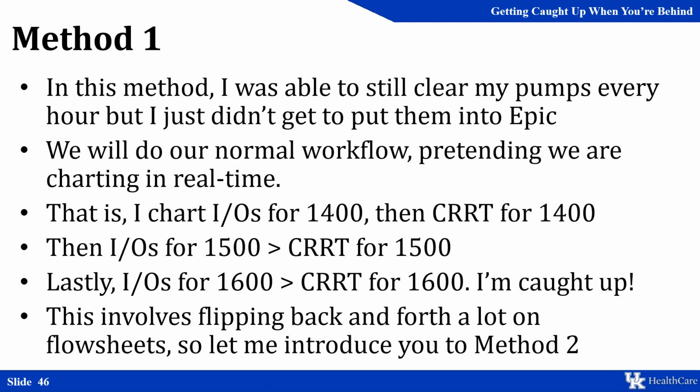However, we have to kind of leapfrog each other on the I and O flow sheet and then the CRRT flow sheet. Thus, we'll chart I's and O's for 2 o'clock, then CRRT for 2 o'clock. We'll go back to I's and O's and chart them for 3 o'clock, then CRRT for 3 o'clock. Lastly, we do our I's and O's for 4, and then CRRT for 4. Like I said, it's a little bit more work, but it'll work correctly every time.